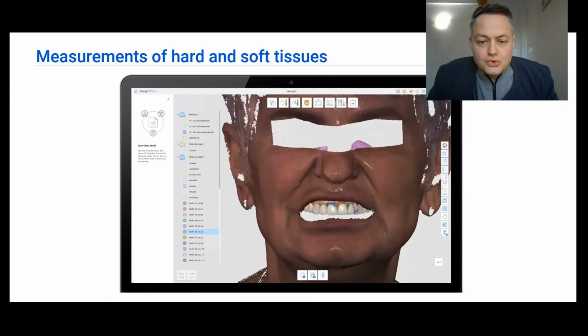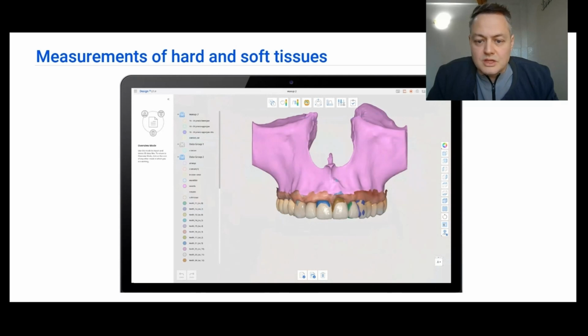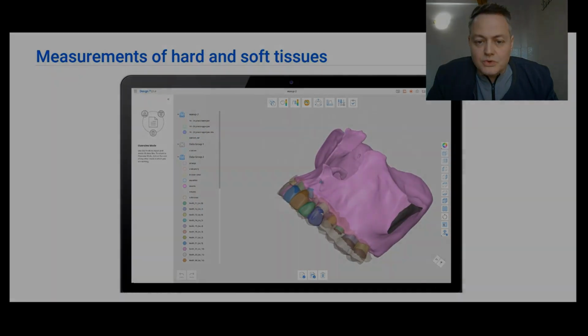to be able to do crown lengthenings, to know if the bone is going to be remodeled or only the gingiva to be cut. You are going to know.